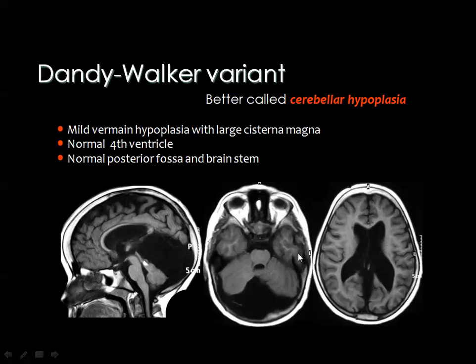In this picture, you see that in this disease the cerebellar hemispheres are hypoplastic. The vermis is more or less present, partially hypoplastic, and there is some communication between the cyst posterior to the cerebellum and the fourth ventricle. But in some sections, you can see that the vermis is present. Hydrocephalus supratentorially is not usually present, but it can be seen in some cases.